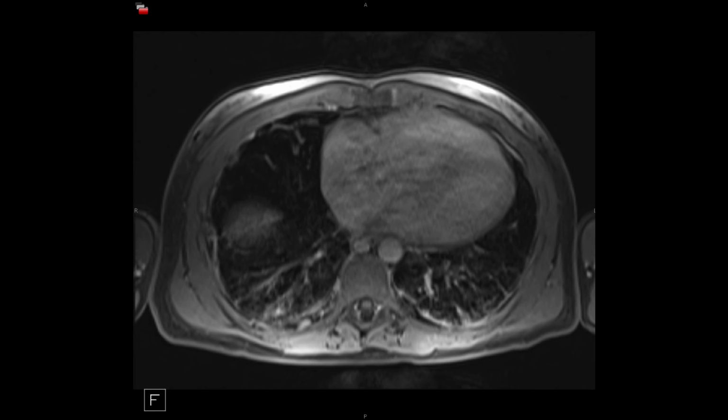So we looked at some different imaging techniques. So just to summarize, if you have a patient with acute PE, it presents with central filling defects that appear like pieces of material that have kind of sausage shapes and convex margins. As the PE starts to resolve, it becomes adherent to the wall.